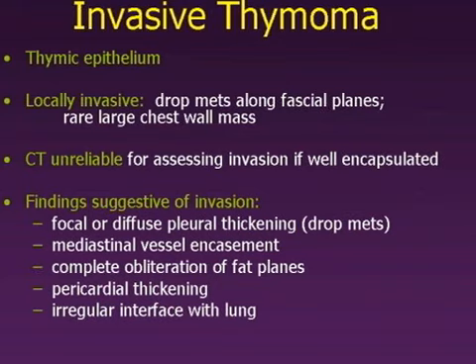CT, in fact, is quite unreliable for assessing invasion of an invasive thymoma, if it's well encapsulated. If you see an infiltrating mass in the anterior mediastinum, then you can be pretty sure it's an invasive thymoma. But the absence of detectable invasion, unfortunately, doesn't rule out the possibility that it's an invasive thymoma. Hence, surgical resection is indicated.